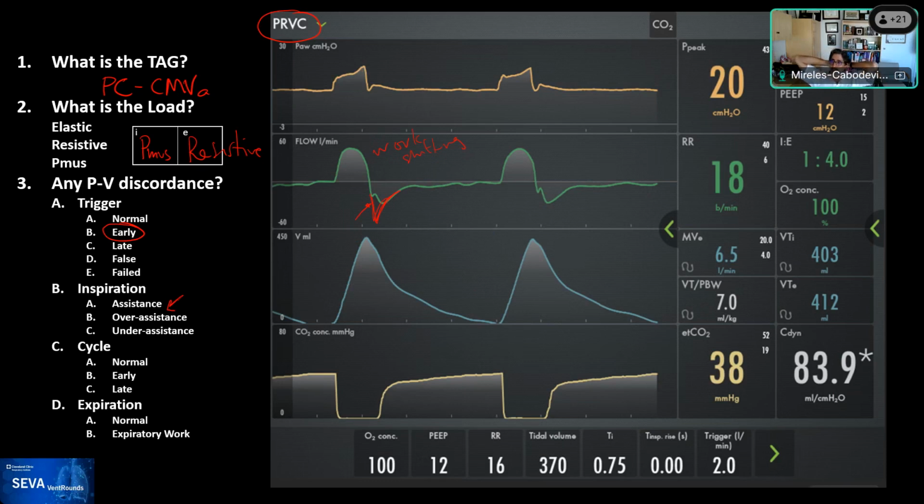That's something that we have discussed in the past, in which the patient is getting as much flow as it needs. Actually, the pressure is above the baseline. So it just means that there is evidence of PMUS, not of inadequate flow. And that's why we think that the term flow asynchrony or flow starvation for these abnormalities is not the right term to use.